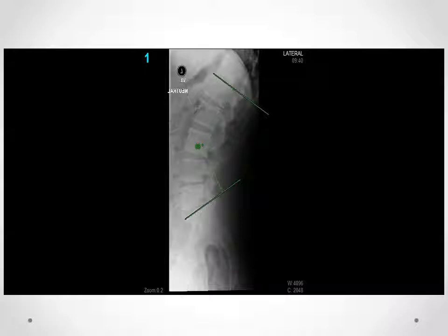So imagine this: we have a lumbar lordosis angle of 60 degrees. We're now going to put the injured worker through movements of flexion and extension, and that lumbar lordosis is going to change from its neutral position of 60 degrees. It's going to reduce as the spine goes into flexion. It's going to increase as we go into extension. And measuring the lumbar lordosis angle in the neutral position gives you a starting point.